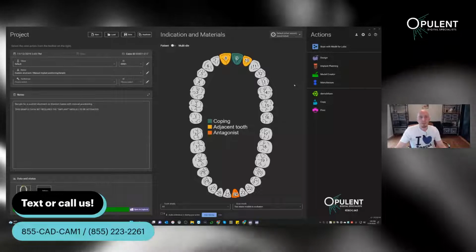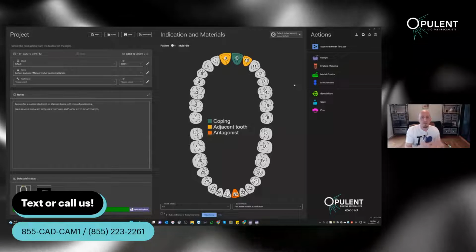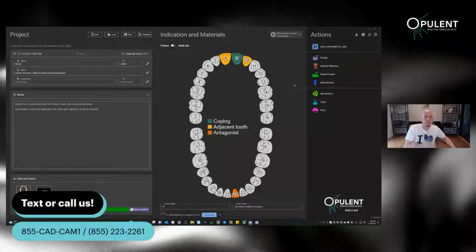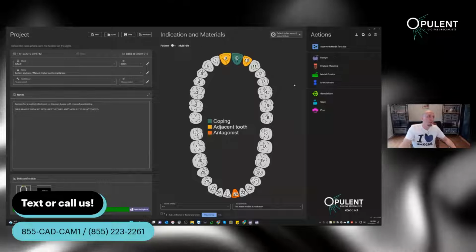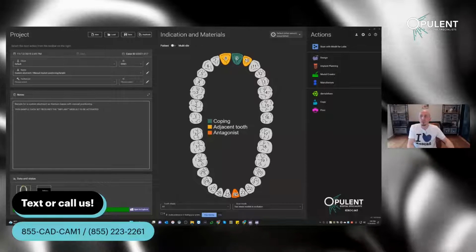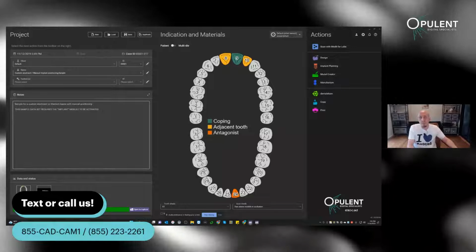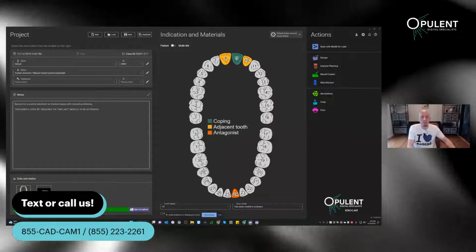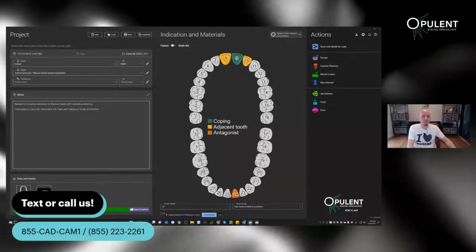Methods integrated, also integrated, and comes in one package, and that includes the demo cases. And so this is one of the demo cases here. Some of them have in the notes little links basically in there. You have to copy paste them. They're not clickable, but you can basically then watch a YouTube video from Exocad themselves, and they're quite helpful.